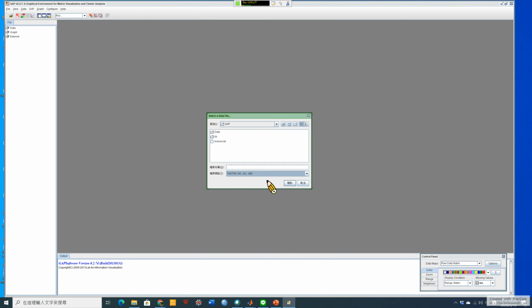I don't know why, but the program is also always a very complex job and task. So in this software, the input file should be a text file.